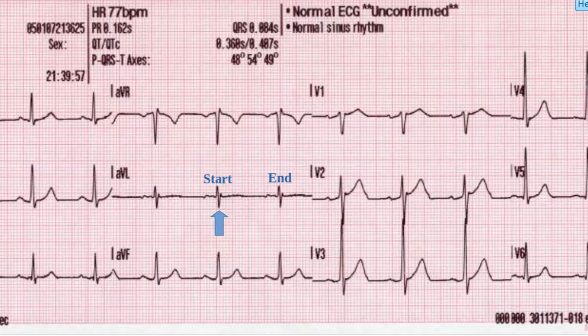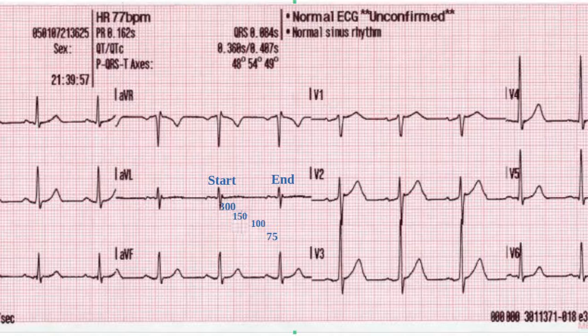That is our start line. Ignore the thin lines. We only name the heavy lines that follow our start line. There are just 6 numbers you need to memorize: 300, 150, 100, 75, 60, and 50.